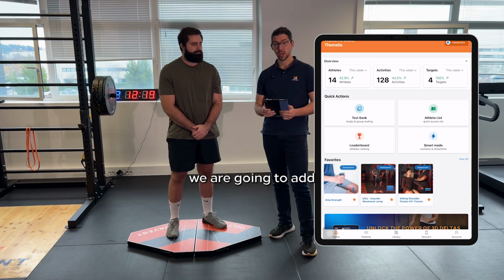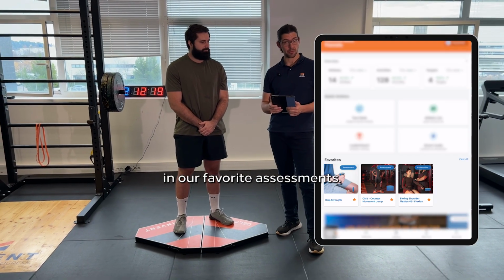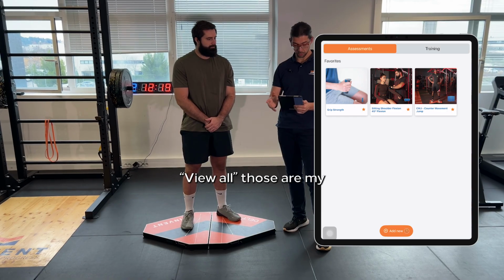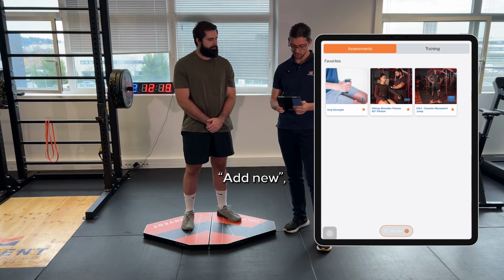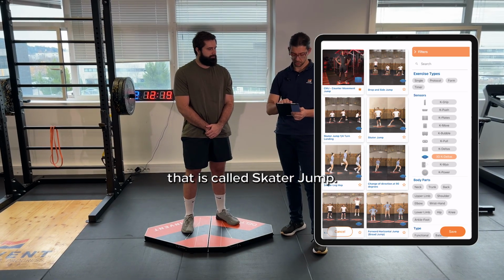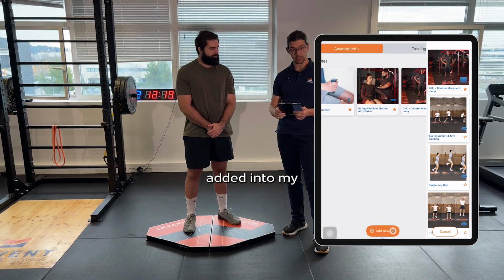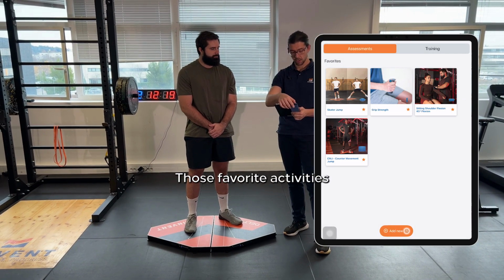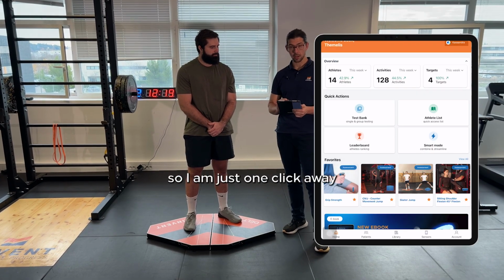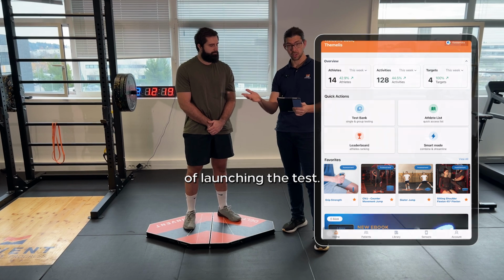First of all, we are going to add the skater jump in our favorite assessments. So I'm going on it. View all, those are my favorite ones. Add new, a 3D deltas assessment that is called skater jump. This one is now added into my favorite activities. Those favorite activities are on my initial screen, so I am just one click away of launching the test.